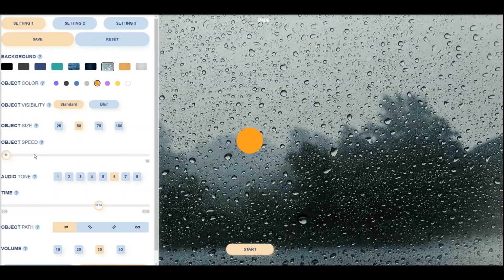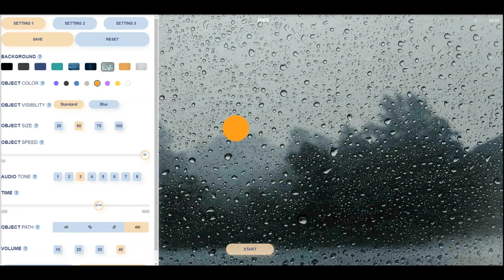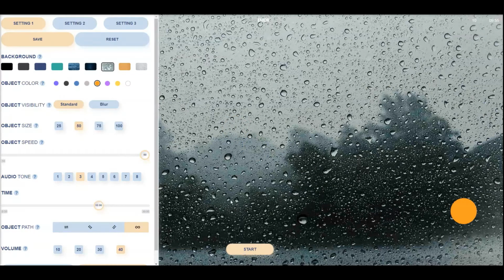First, when you're working on desensitizing your negative memories, which is called targeting in EMDR, it can be very helpful to make the eye movement tool software go faster and also increase the volume so it is louder in your ears. You can adjust both of these settings in the eye movement tool menu. Also, when you're desensitizing your negative emotions, it can be helpful to select an audio tone that is less pleasant to listen to and sounds more jarring in your ears.